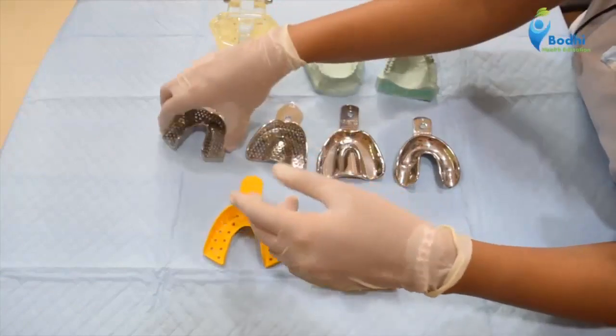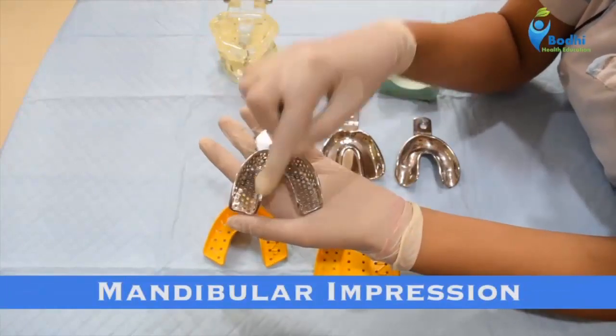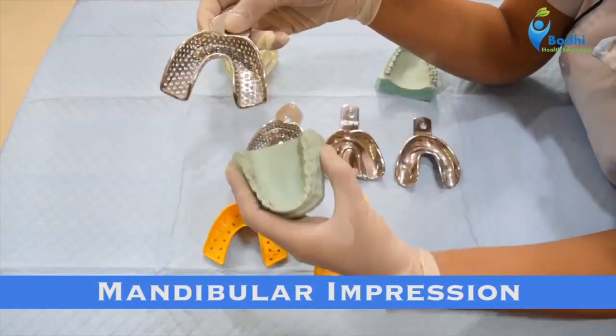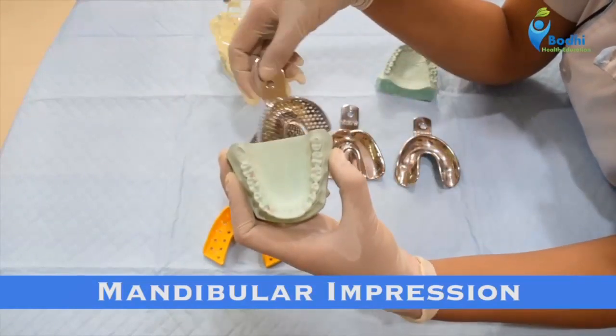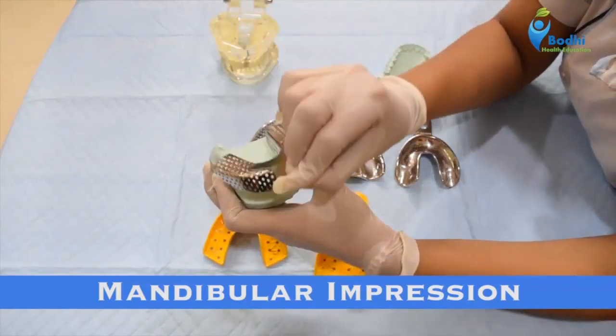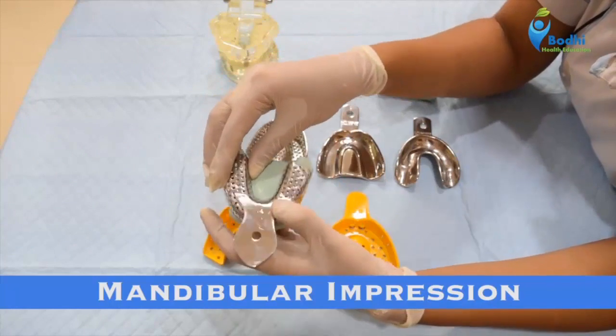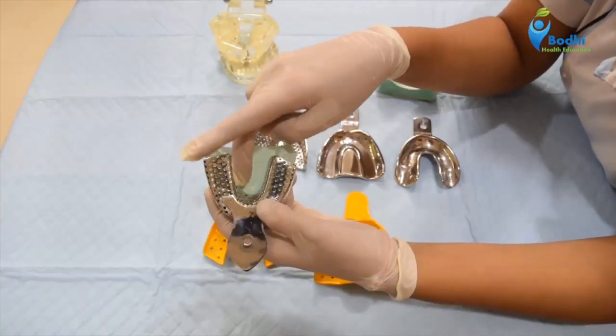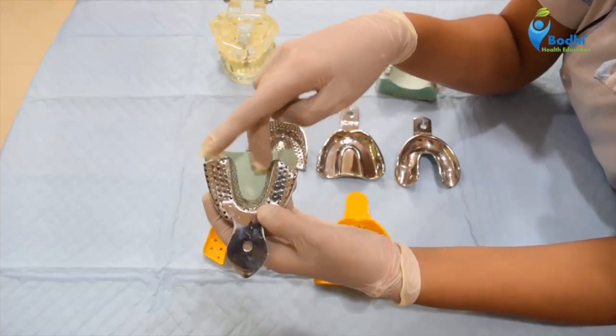On the contrary, the mandibular impression tray has got the lingual flange area. While recording the mandibular impression, as you can see, this is a mandibular teeth model. This mandibular impression tray fits like this and it records the lingual area through this lingual flange.